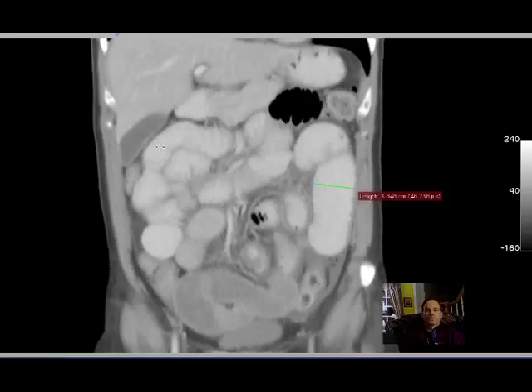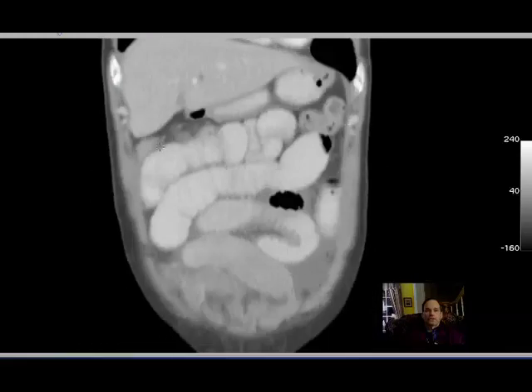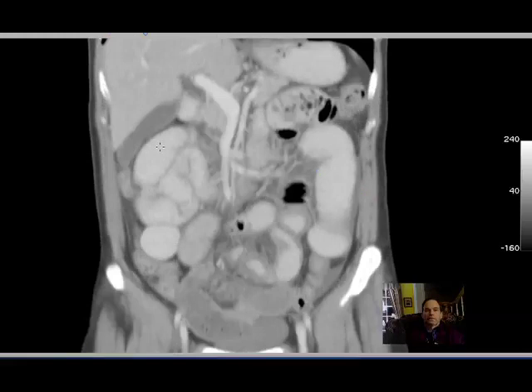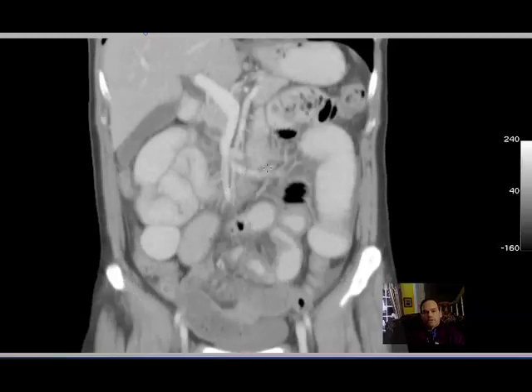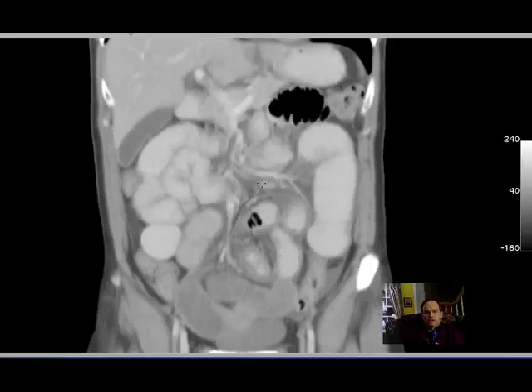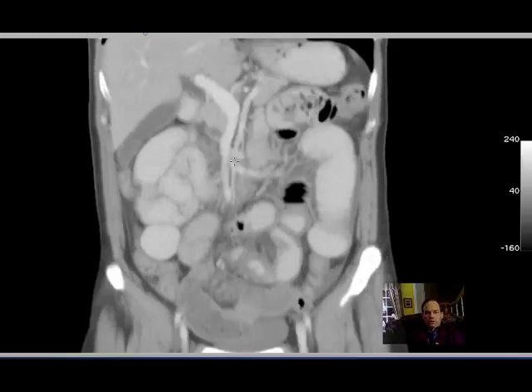Let's follow that portal vein, and we should see it branch off to left and right, sure enough. Okay, now backing up, portal vein, superior mesenteric vein. This looks like inferior mesenteric vein because it looks like it is coming from bowel over here and converging on superior mesenteric vein. So that looks like where the coalescence of SMV and IMV is occurring.